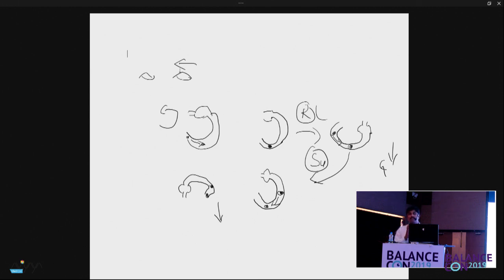That is why we should not stop at words. Only saccadic pursuit, only macrosaccadic oscillations, only hypometria, only hypermetria, only glissade. If you see, we are still at words. Now, how to form sentences out of these words is to take a combination of findings, and that is exactly what is written in the next material that we have shared. Here I will take one example to drive home the point of how to make sentences.